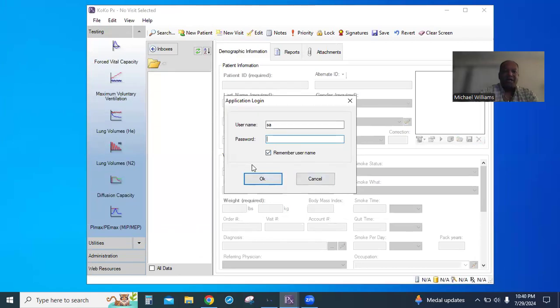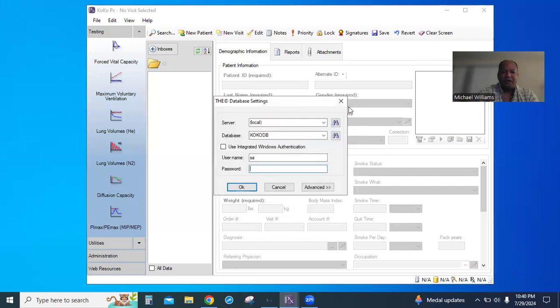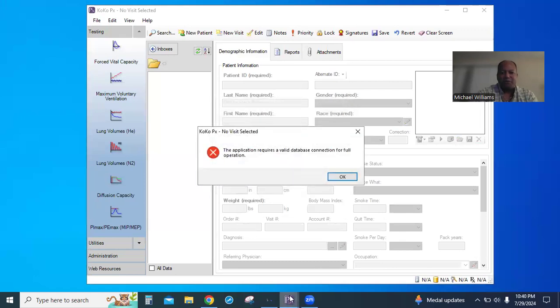Okay, so what you see here is a demo of the KoKo SX, and very simple, intuitive piece of equipment.